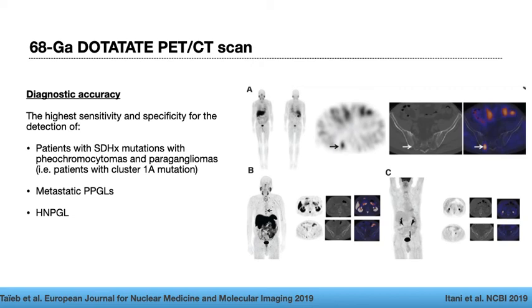That MIBG study showed increased uptake in multiple osseous lesions indicated by the white arrows. The patient had been subsequently treated with iodine-131 MIBG therapy at that time. Recently, the patient presented again with elevated tumor markers. An FDG PET scan was arranged, which is shown in panel C. It showed minimal to no uptake in the whole body. To assess for any occult recurrent disease, another PET scan was performed 1 week later, but this time using gallium-68 dotatate, which is shown in panel B, and demonstrated widespread somatostatin receptor positive bone metastatic disease with marked tracer uptake, which is indicated by the arrows.